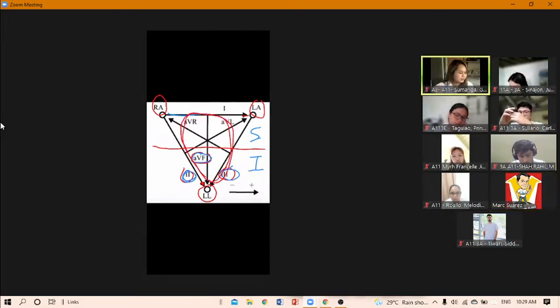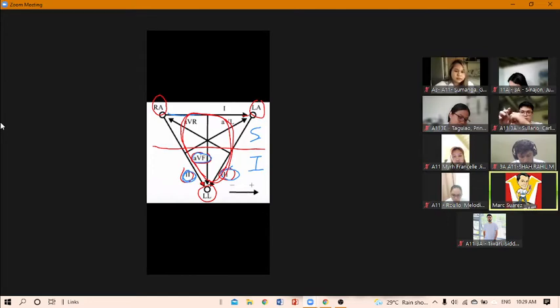Yes, Doc. Okay. Now I would just like to say to everyone, any ECG changes in lead 2 or lead 3 or aVF must be contiguous. What do I mean by contiguous, continuous?